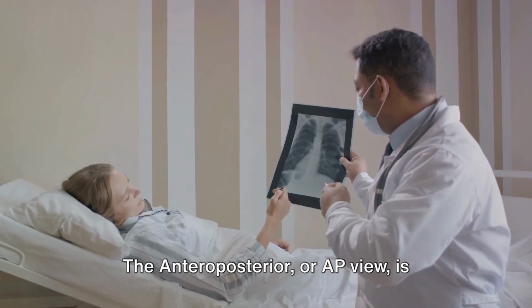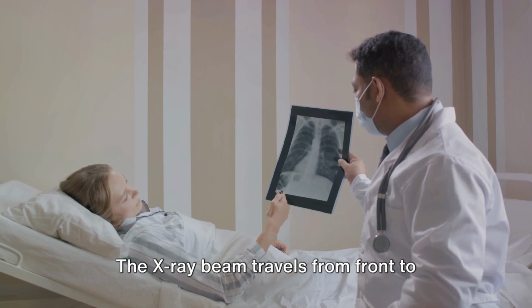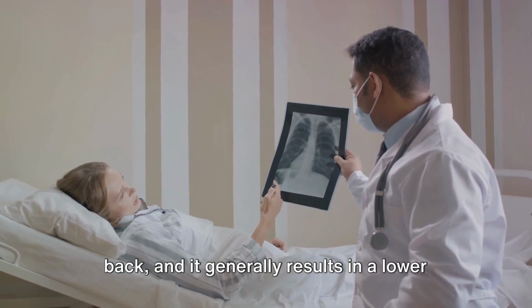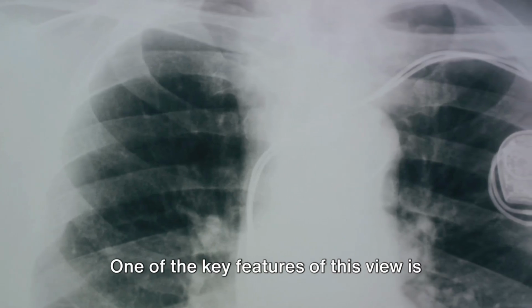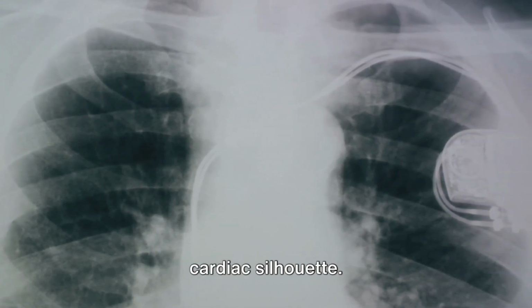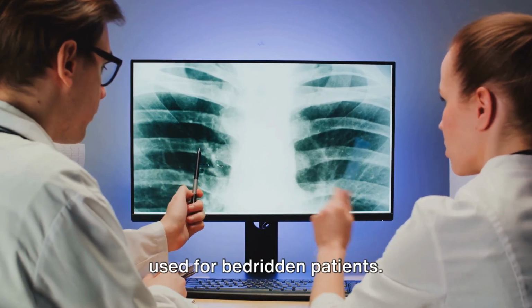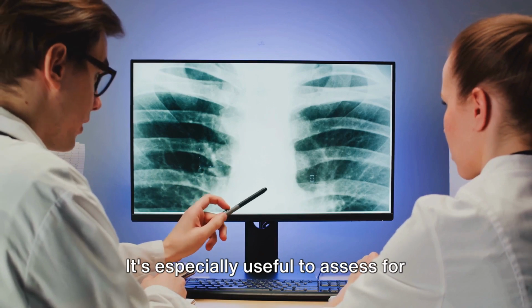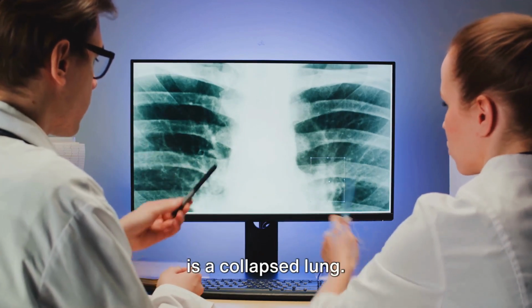The anteroposterior, or AP view, is typically used for bedridden patients. The X-ray beam travels from front to back, and it generally results in a lower quality film than the PA view. One of the key features of this view is that it can cause an enlarged image of the cardiac silhouette. The lateral decubitus view is another one used for bedridden patients. It's especially useful to assess for pleural effusion and pneumothorax, which is a collapsed lung.